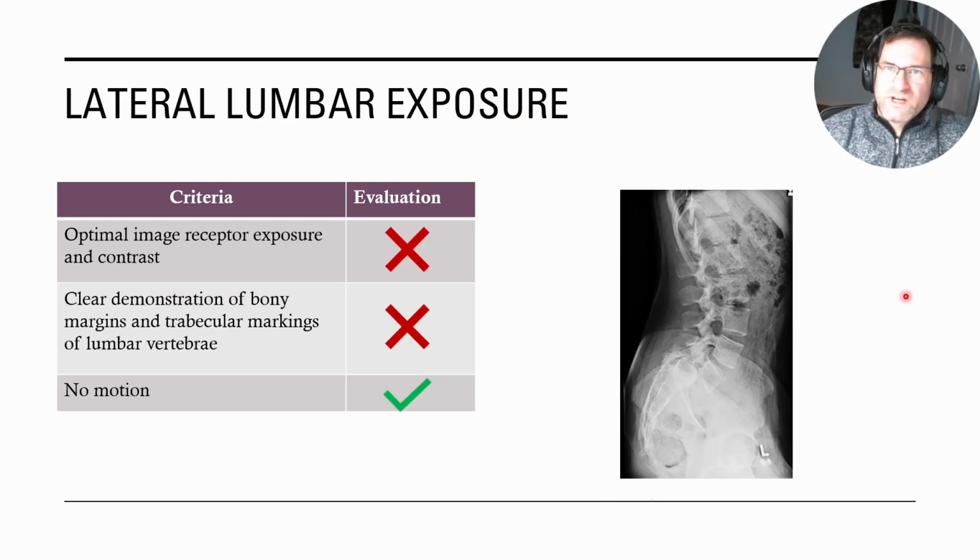So our exposure factors. We got a lot on in the abdomen, and we just turned it up to a 10 with our technique. So it is definitely not good. We have too much technique, probably had to bump the kV and the mAs down at least a step or two so we can get a good exposure factor. Also, our collimation probably had a lot to do with it. So the first two here, no, and there's no motion.